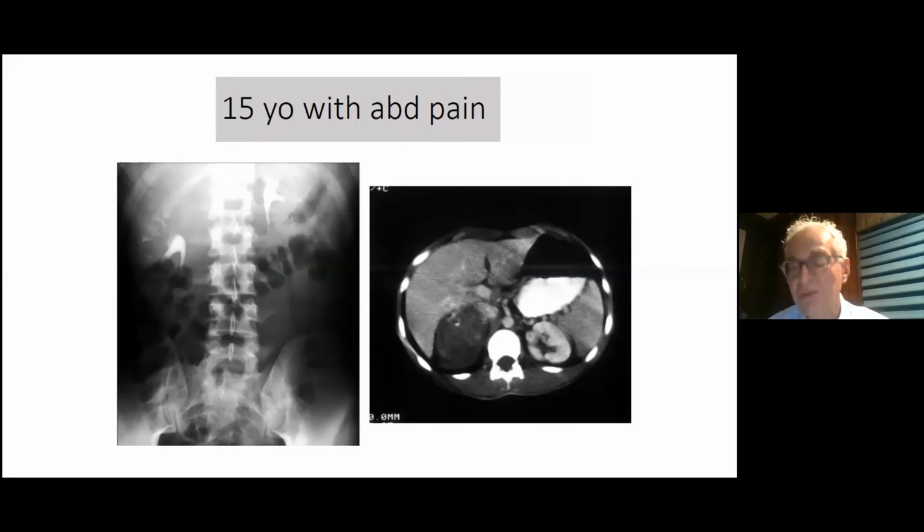It's an adrenal mass, absolutely. And this was a ganglioneuroma. Neuroblastomas mature into ganglioneuromas mostly. The majority of neuroblastomas are not clinically relevant. We know that because in Japan, they used to do screening for neuroblastomas, and they found way, way more neuroblastomas than the number of kids who presented with neuroblastomas. Most of them mature into ganglioneuromas, and that's what this kid had. His abdominal pain was totally incidental. He was trying to get out of prison, but it was really a fascinating case. We wound up taking it out, but we didn't have to. We didn't know any better in those days.